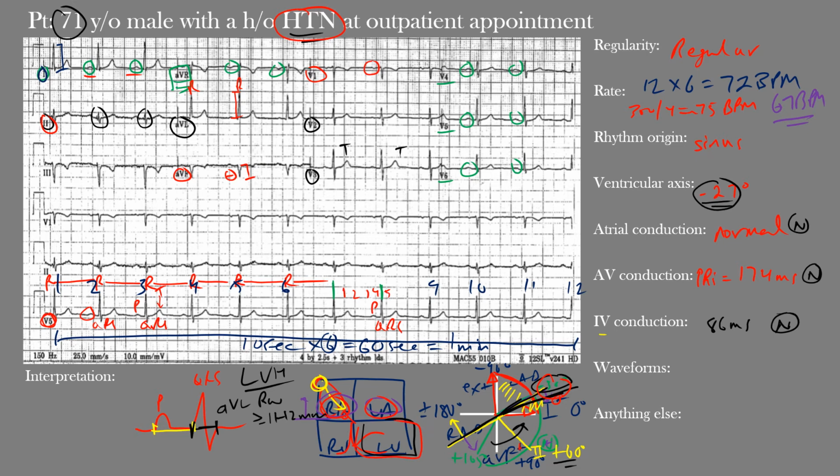And that's one thing that can support this. Otherwise, there's no supporting evidence of left atrial enlargement or prominent U waves that may sometimes be seen with left ventricular hypertrophy. Anyways, the main thing here is that the minimal voltage criteria for left ventricular hypertrophy is met in lead AVL, but may simply be a normal variant in some cases, and even here. So hopefully that makes sense.